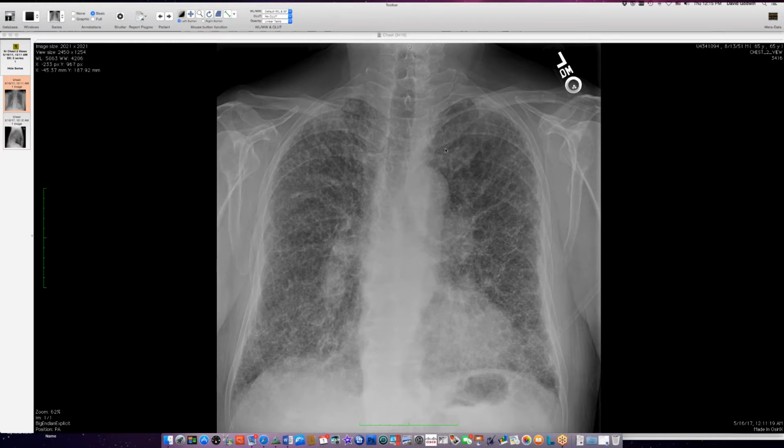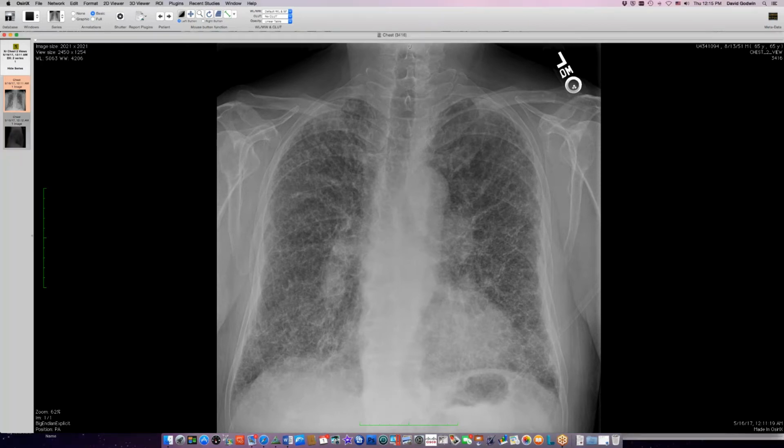We do. So this man is about 65 years old and has a history of rheumatoid arthritis. He has this chest radiograph here with lots of interstitial abnormality and a bubbly look in the bases down here, but preserved lung volume, surprisingly. Now, he had been a cigarette smoker until a year before. He's had this lung disease for several years, and it's presumed to be related to his rheumatoid arthritis. His rheumatoid arthritis is not erosive, so he doesn't have a lot of bone findings. He's got some degeneration, but that's about it.